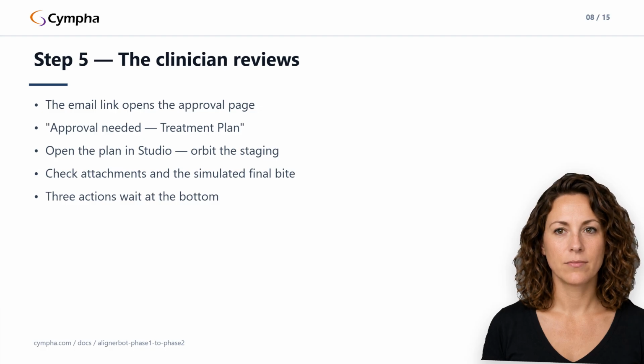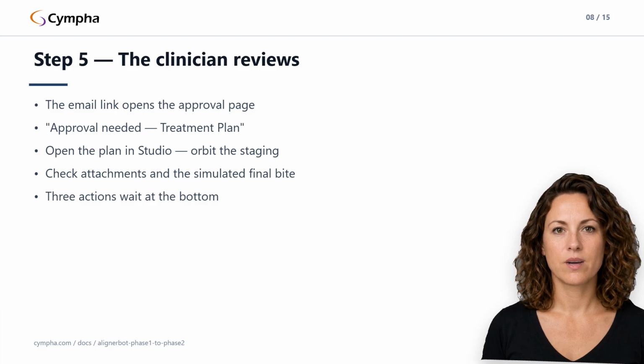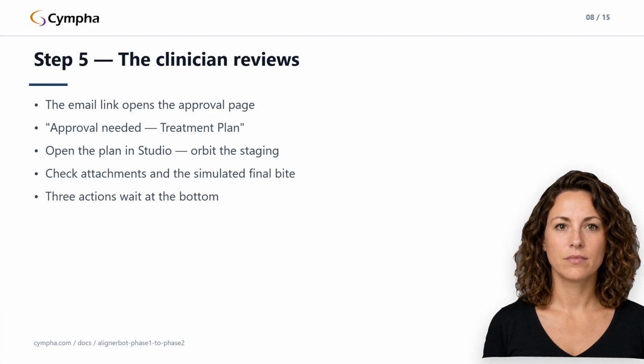OrthoPlus finishes with a zip of design results in a transfer pack. The agent uploads both automatically, and just like phase 1, the transfer pack arriving via the agent fires the second approval by itself. The case flips to awaiting approval again, now labeled appliance approval pending. The clinician gets another email, returns to the approval page, reviews the appliance files, and approves. The status pivots through approved and, this being the final cycle of a digital category, advances to delivered, with no manufacturing step. That's the clean round trip, end to end.